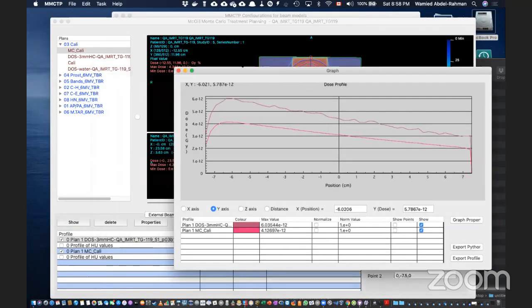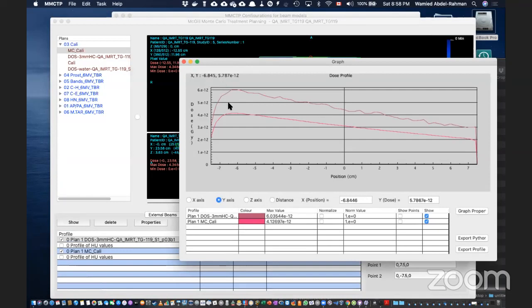What I'm struggling with is this curve I obtained with an 8-hour simulation. I kept everything the same, then repeated the simulation, but instead of 8 hours, I used a larger uncertainty, and I'm getting a different curve.